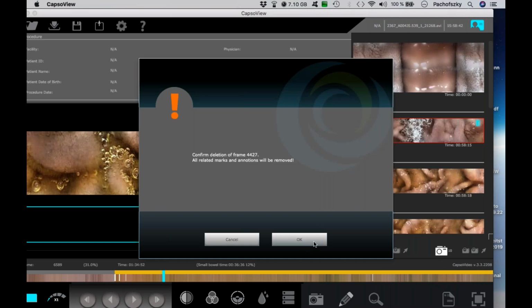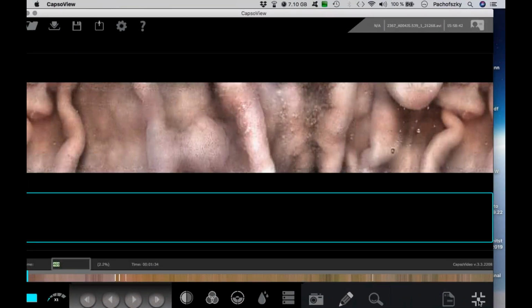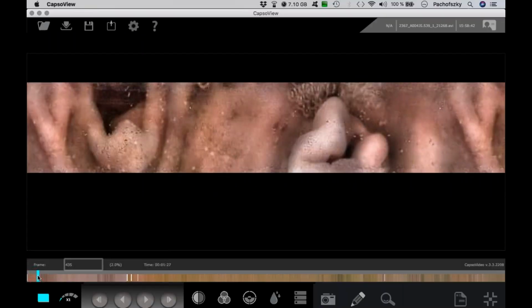So now we have all of them gone, and we have here nothing we can see. So in this case, we will start the same way as before. First, I click here inside and I'm going down.